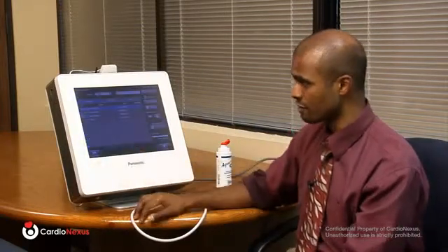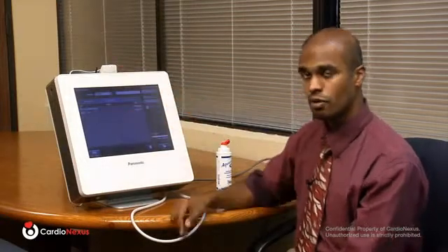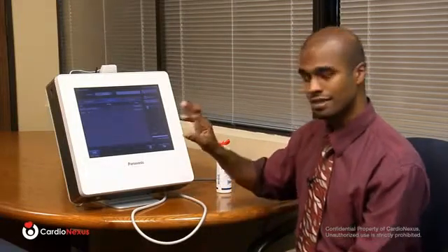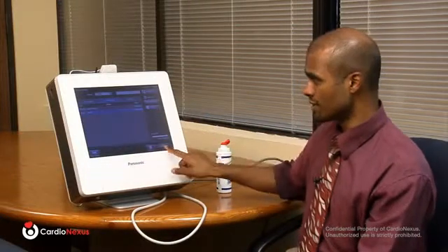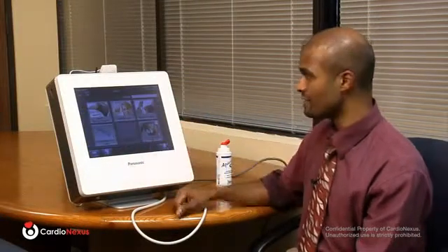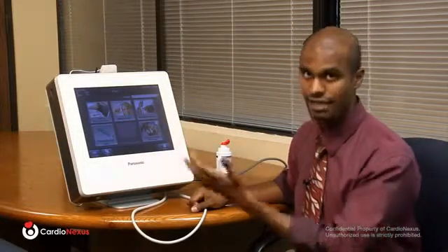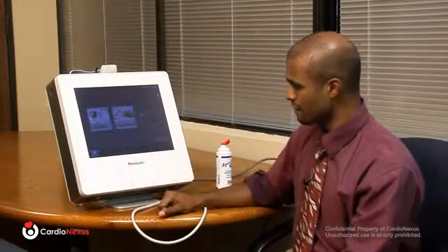I'll get back to the study records page. You have a tab for in progress. The in progress tests are essentially, if you don't have the blood work for that person at that time, you can choose to basically suspend the study. It'll save, and as soon as you get the blood work back, you can then restart that suspended exam and then fill in any of the other information to see the report at a later time. So there's that suspend button there.